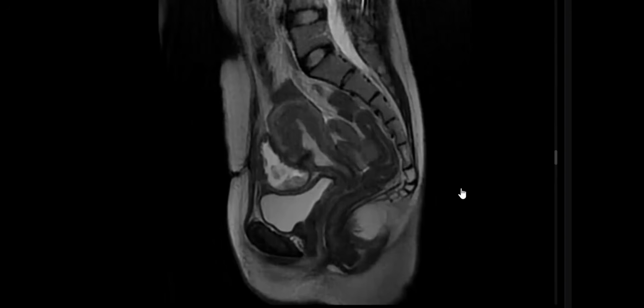A post-cesarean collection between the anterior uterine wall and the posterior bladder wall is named bladder flap hematoma. Yes, okay. And if secondary infection occurs, it's an infected bladder flap hematoma. If continuous with the endometrial cavity, then dehiscence with bladder flap hematoma. This is important and a very common complication.